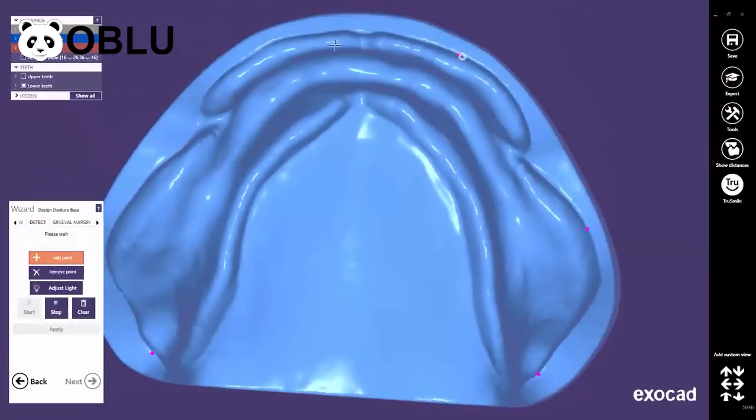Once you have added the 4th point, the calculation automatically starts, but interrupts if you continue to add points. Restart the calculation by clicking on the Start button when you have placed 6 to 8 points. Certainly, you may change the draw mode if adjustments are required.